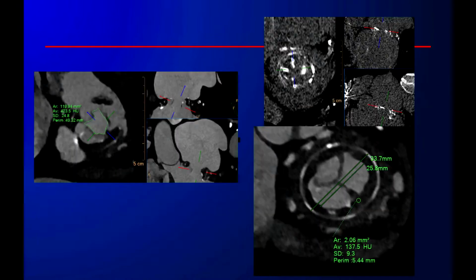So what do we do when we evaluate a mitral bioprosthetic valve with CT? Number one, for the fellow, very important, look at the non-contrast images, to give you an idea how bad the calcification is. Definitely this patient has degenerative changes, okay? And then you need to measure the size of the prosthesis, both internal and external. And the most important part, which we do very well, is you look throughout diastole to find the maximal opening of the mitral valve leaflet. And when you have that phase, you go in and find the narrowest part, okay?